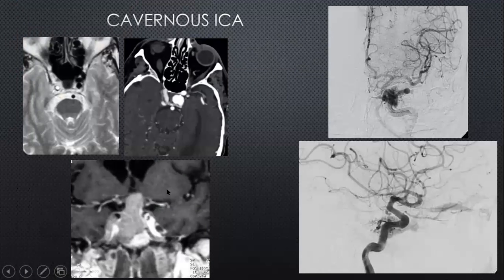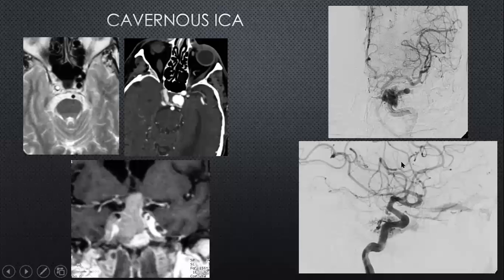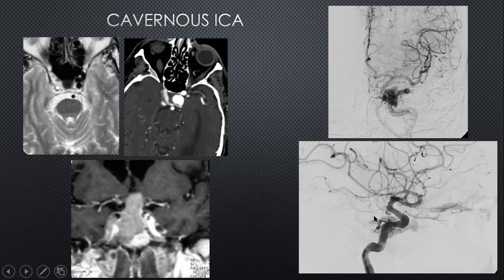Some of the pathologies, I don't want to labor too much on the pathologies. I think Dr. Hilditch will talk about them, but it's important to recognize the flow voids, which is what we have to see when we look at the pathology. Absence of flow void suggests, of course, thrombosis or very slow flow through that vessel, or the vessel can be very big, for example, an aneurysm of the cavernous carotid artery. And also sometimes these are uncommon pathologies, but we see them at Salford because we get referred them from the eye hospital, from the neurologist, is the fistula.